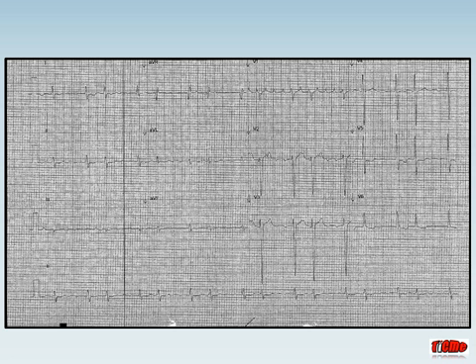And one of the best ways to tell, first of all, we look at morphology, and if we look at each of these P waves here, they do look to be quite similar in morphology. However, there appears to be more P waves than there are R waves. So that tells us whatever's going on, there must be some block at the AV node, as not all P's are conducted. And the next question is, what is the rate of the P wave? Now remember that the sinus node really can't go above about 220, 230 beats per minute. Remember, the AV node won't conduct more than about 220 minus your age. So we have a look at the rate of these blips.